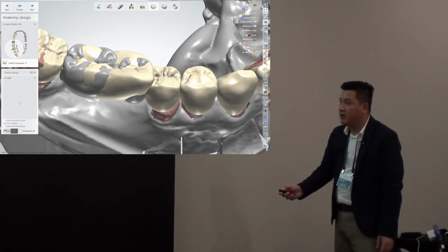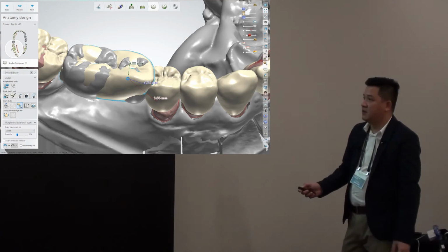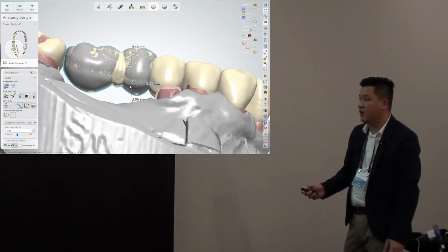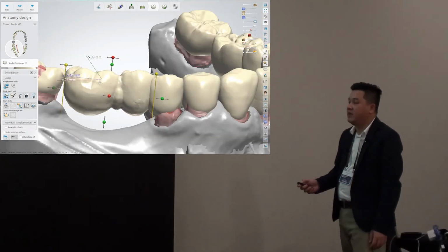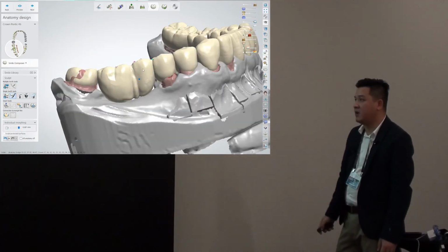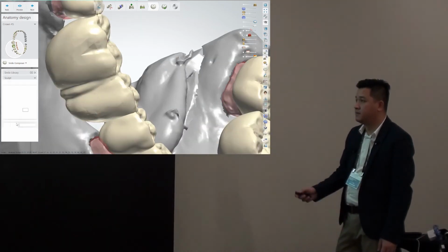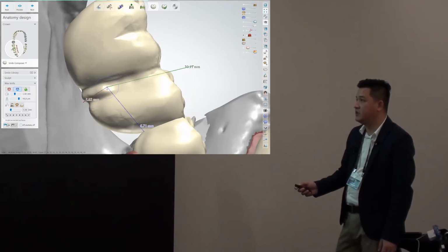Now we click it and it gives you that sad, kind of wrinkly copy of the pre-prep, but this beats going back and doing 2 hours of redesign to add a premolar, right? So we make this copy, it'll morph to it. We have to clean up the embrasures a little bit. Maybe we need to carve the anatomy a little bit more, rotate things around a bit. Bring these down, make sure it's nice and intimate with the tissue.